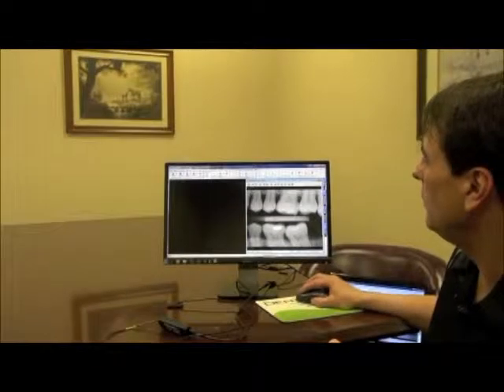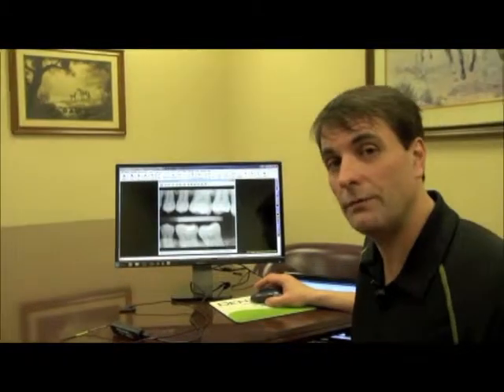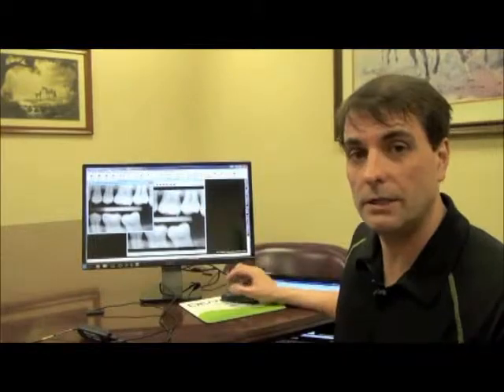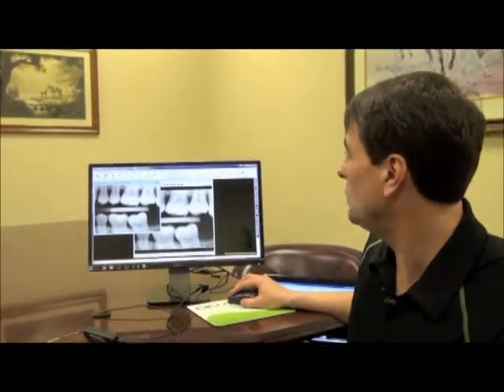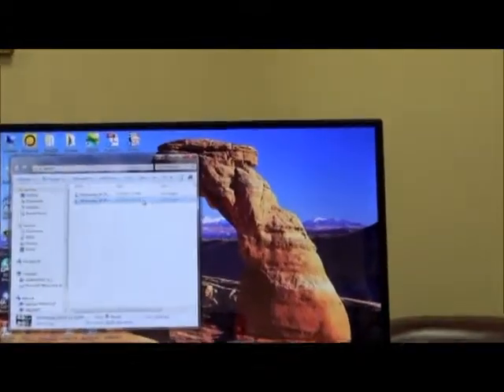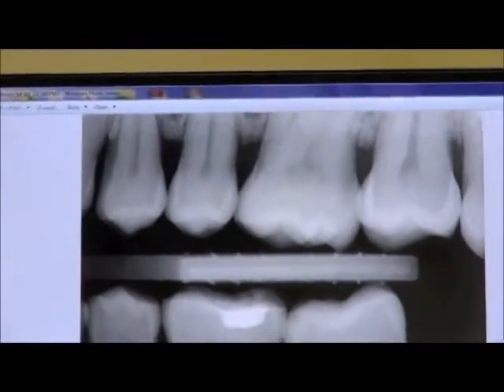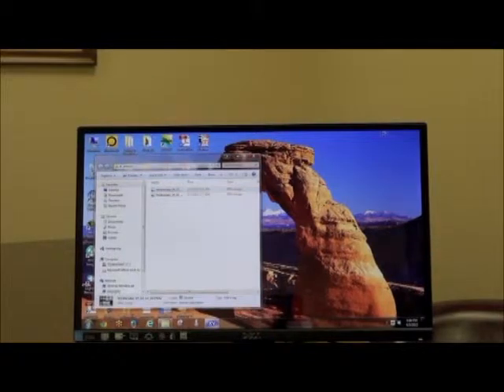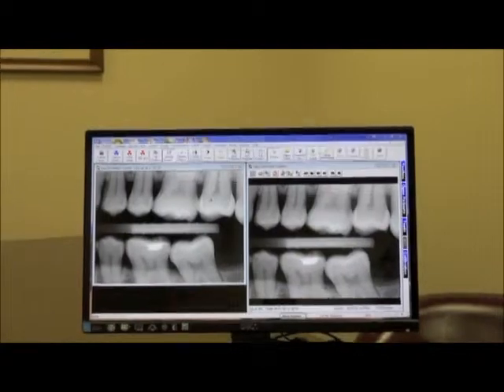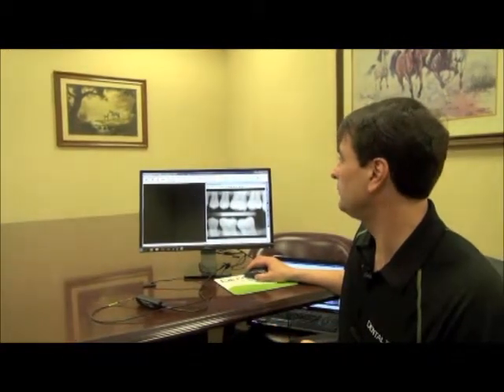it. If you want the image to be exported with the real-time filter applied, you'll want to hit the duplicate button so it pulls it out as an individual image, and then hit export. Now when I go to my export folder to attach, you'll notice that image has been exported with our filter, so it's sharper. So whenever you're doing the export for individual images, always hit duplicate so they are exported with the real-time filter. I'm going to close that image so we don't get rid of it.